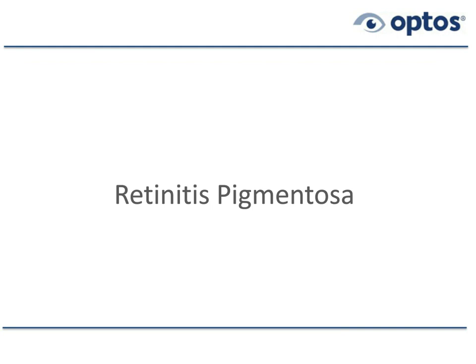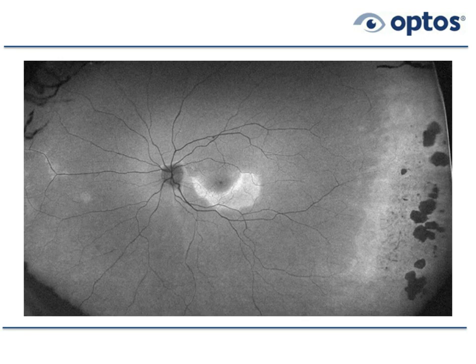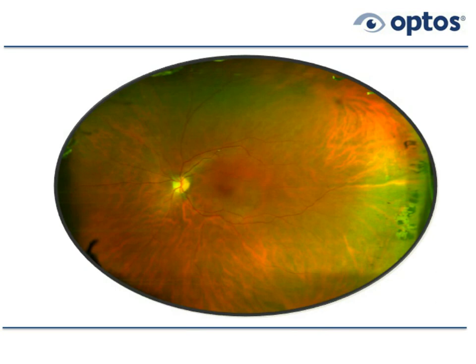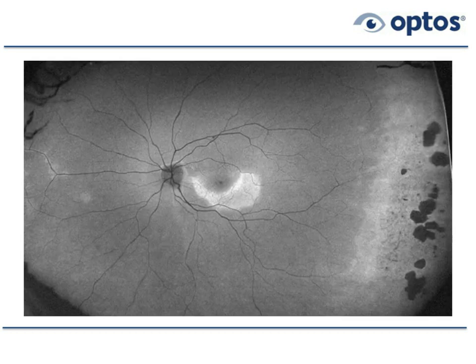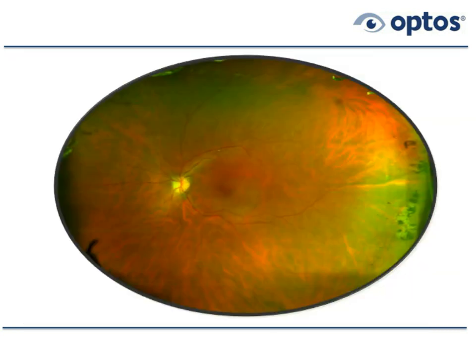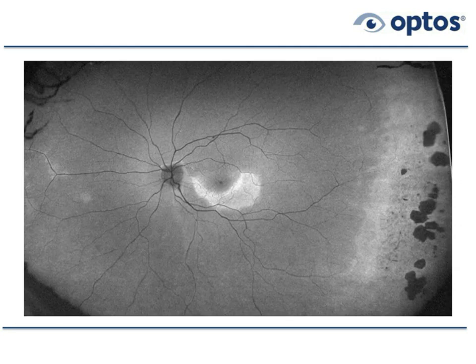Let's go back and just show you that again. Okay, so here's the right eye and the left. We had a transition which is not showing up for some reason. But in any instance, clearly, you can see that this was invisible to ophthalmoscopy. In a sense, the macular lesion is invisible to ophthalmoscopy. Clearly very easy to see on autofluorescence in both the right and left eye. And ERGs were done. ERGs are reduced by about 50%.